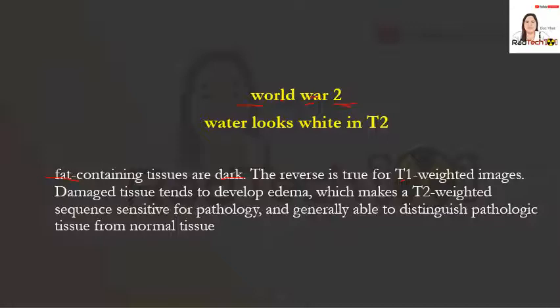Damaged tissue tends to develop edema, which makes a T2 weighted sequence sensitive for pathology and generally able to distinguish pathologic tissue from normal tissue. So as mentioned sa previous video natin, yung T1 is good for anatomy and T2 is good for pathology.